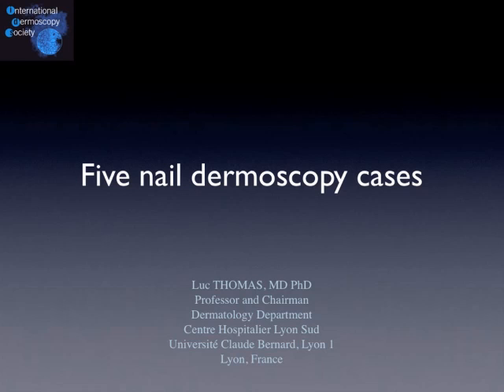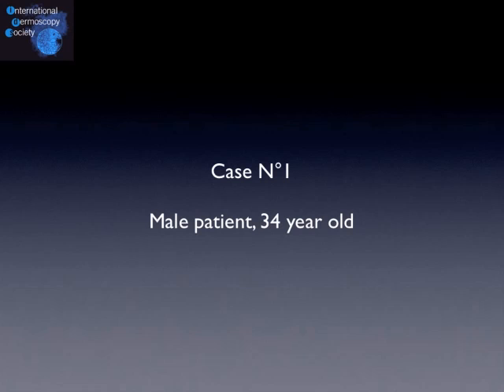You will see 5 nail dermoscopy cases with comments. You will have first the clinical images and then some information if needed. You will have some time to think about the dermoscopy image and then we will comment the case. Let's start with case number 1.